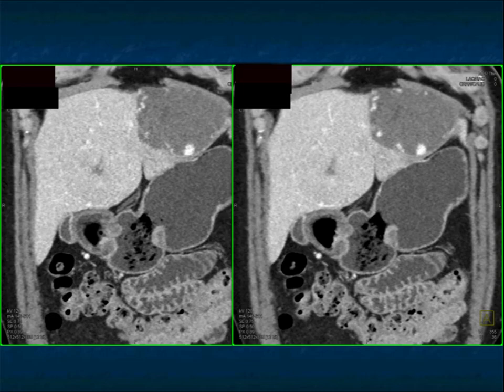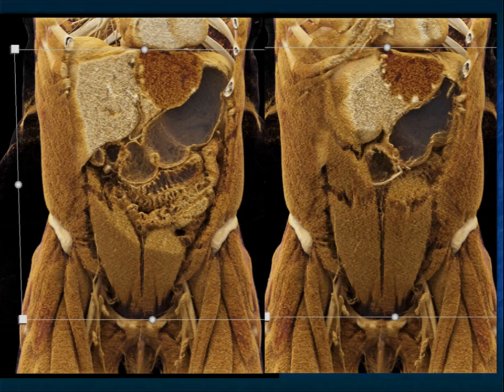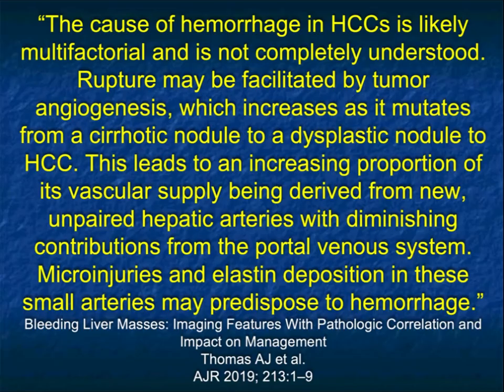And if lesions look atypical, one looks typical, one looks atypical, perhaps that hemangioma would be atypical for hepatic adenoma or FNH, but it's perfect for hemangioma. Beautiful example, same case, showing you the cinematic rendering of both the right lesion, which is FNH, and the left, which is cavernous hemangioma.